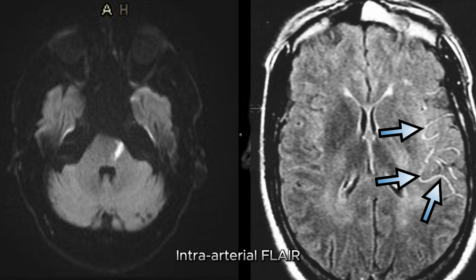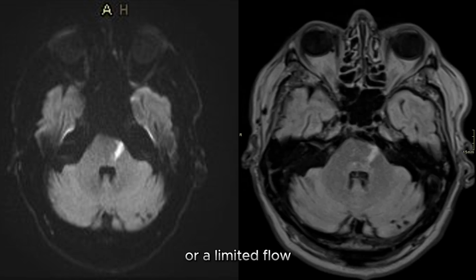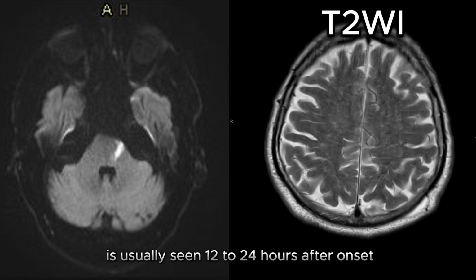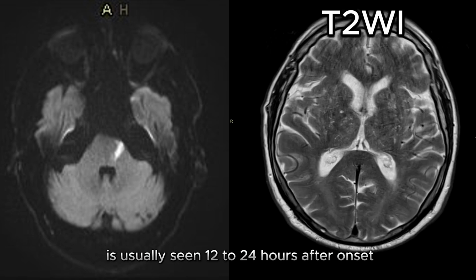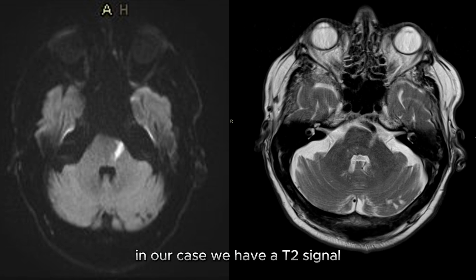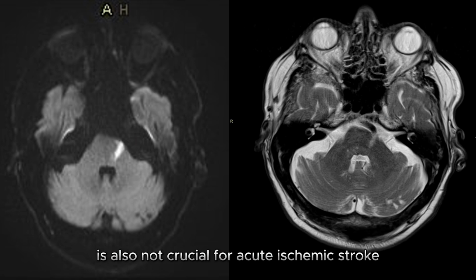Intra-arterial FLAIR hyperintensity is also helpful, as this is an early sign of a major vessel occlusion or limited flow. Hyperintensity on T2 is usually seen 12 to 24 hours after onset. So for a hyperacute case, this sequence is somewhat less useful. In our case, we have a T2 signal hyperintensity matching the DWI. T1-weighted imaging is also not crucial for acute ischemic stroke.